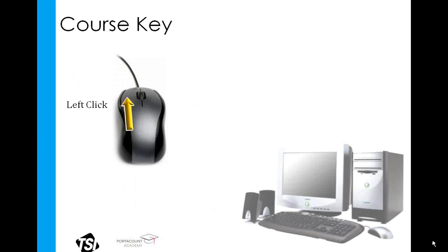As we proceed through this course, you may notice this yellow arrow up here. This represents a left mouse click with your computer mouse.